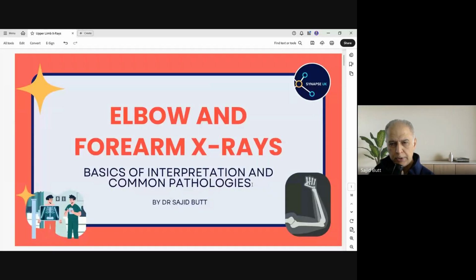Okay, hello everybody. We're going to talk about elbow and forearm x-rays and some basics of interpretation and common pathologies. My name is Dr. Sajid Butt. I'm a consultant radiologist at the Royal National Orthopaedic Hospital in Stanmore.